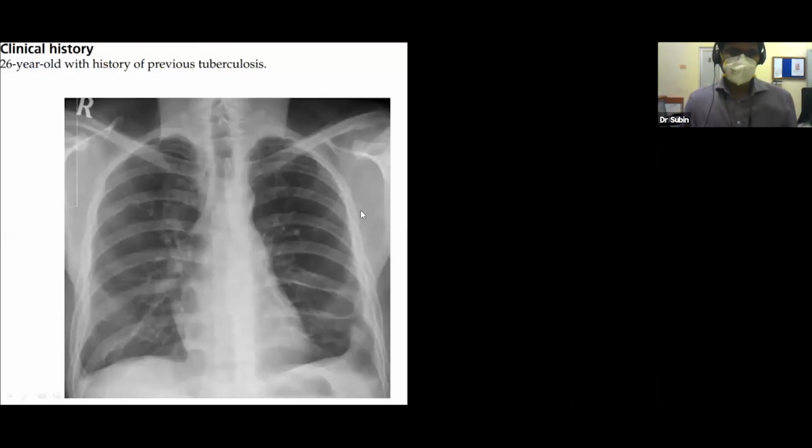All right. So I'll show you a few cases. If anybody can, either talk or chat, whichever way. I've given you the history. What do you think is happening?